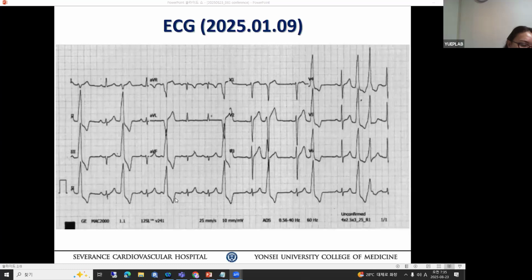If there was retroconduction, what would happen? You would reset the subsequent P wave, right? So you measure the PP interval and figure that out. But if you measure the subsequent 2 sinus beats, the PP is almost the same as that PP interval. Therefore, your conclusion is most likely there's no VA conduction, right? This is an important concept. Why is it so important? I'm asking you this question because this is a little more step forward in our thinking.